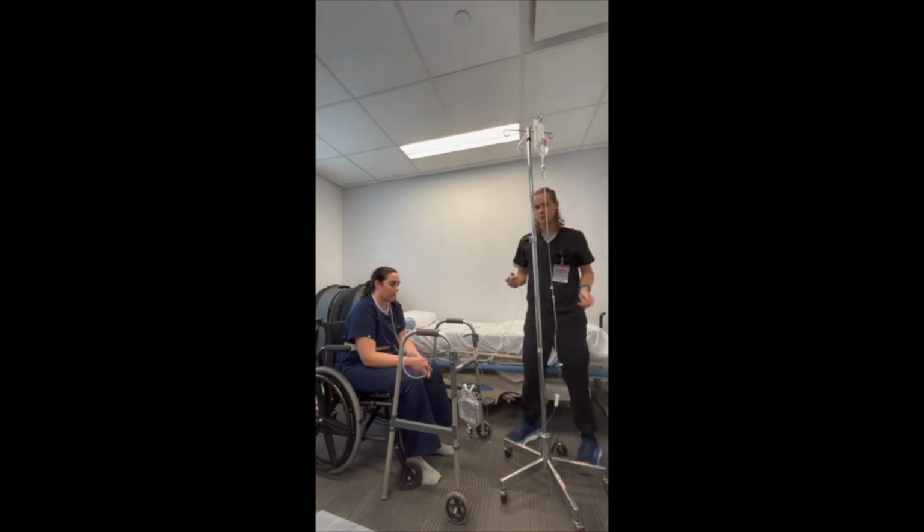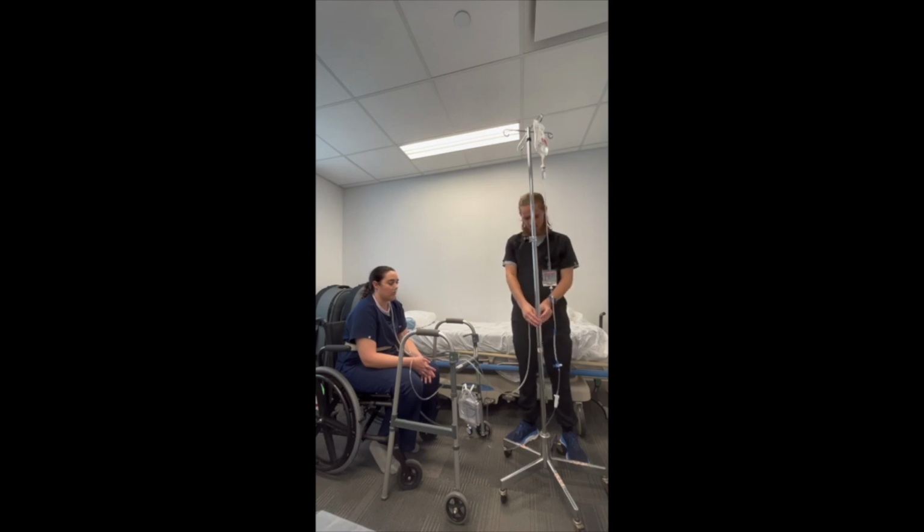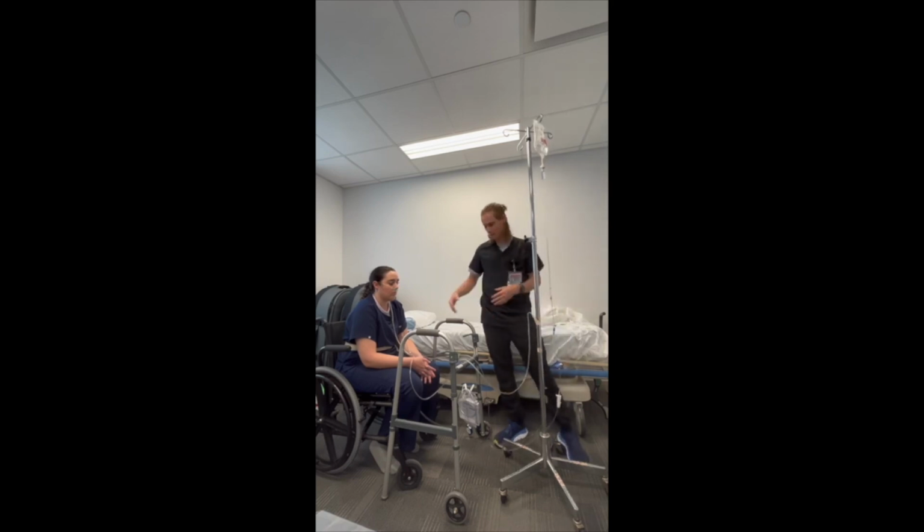And there are a couple of things that you can do. One is IV poles will often have an oxygen tank holder on it, so you can put it there. That's really helpful because it keeps all of the lines and tubes going in the same direction, and keeps our pivot point in the same place, so we know where we need to keep things to maneuver as we need.